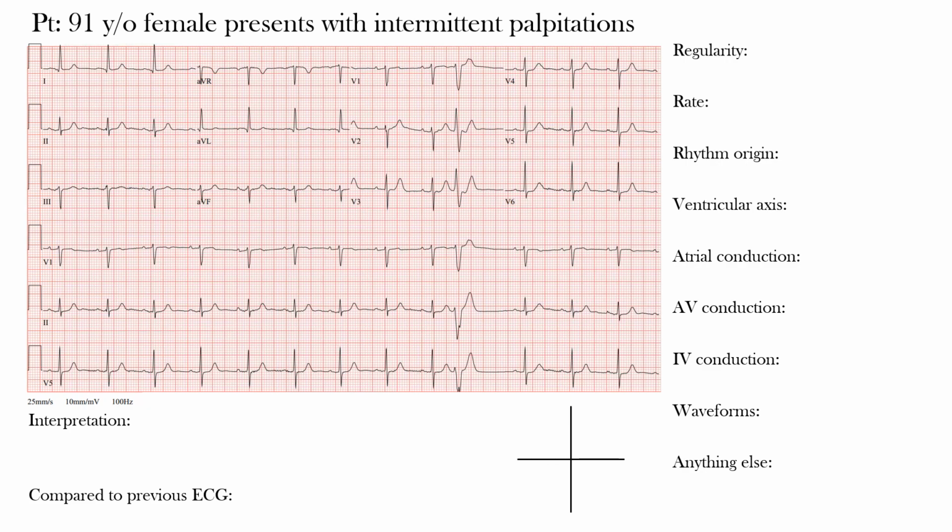Therefore, we would technically call this an irregular rhythm, and because there is regularity to the overall complexes, we call this a regularly irregular rhythm. Okay, so let's look at that now. Okay, so this is a regularly irregular rhythm. All right, so why is that?